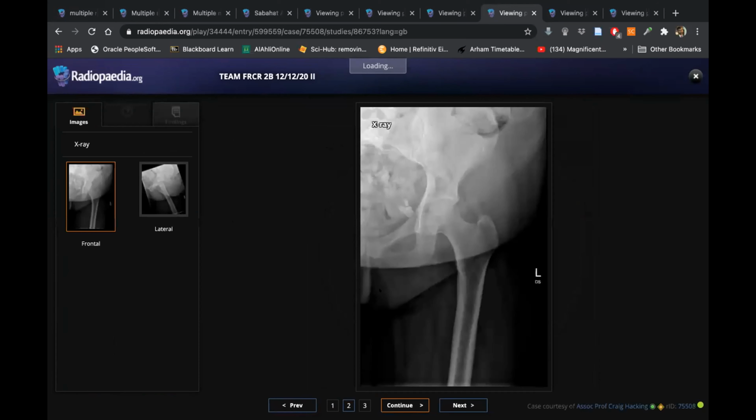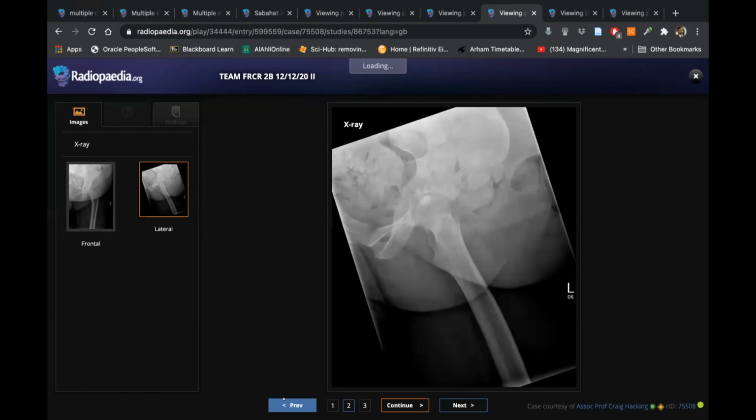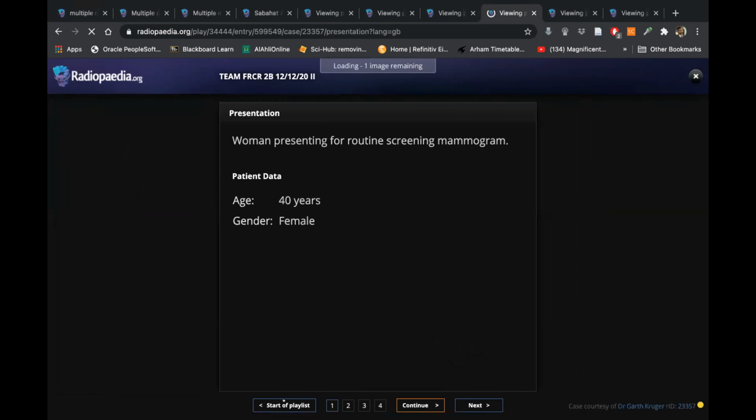This was good. This was the case of left thigh pain, but you had to pick up this tooth, which you did. The complications of the dermoid cyst, you told about the rupture, you told about the torsion, there can be malignant degeneration. So all was good enough. And what we need to know, which Dr. Maheen was emphasizing in my viva as well, is that I don't need surgical details or clinical management details. What I need to know is the radiological findings and then referral. I think we can safely say that this is a dermoid cyst. And if the patient comes with pain, I would be referring the patient to OB-GYN and discussing with them the need for CT to rule out torsion. Like this, it would be good enough.